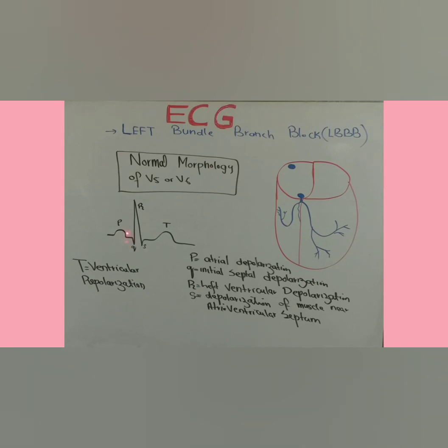This Q wave, a first downward very small deflection, which is negatively deflected, is because of the septal depolarization, which is going away from V5 and V6. So this is known as the physiological Q wave. It has its depth less than 1 or 1.5 millimeter, or less than 1 small box, or less than 1.5 small box. This is known as the physiological Q wave, and it represents the initial septal depolarization going away from V5 or V6. Then the major muscle mass, its wave of depolarization is moving towards V5 and V6, that generates a very tall R wave.